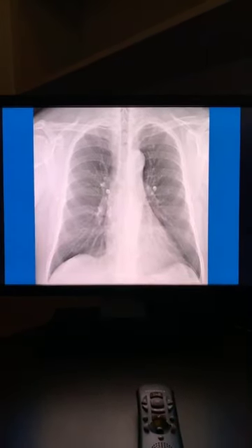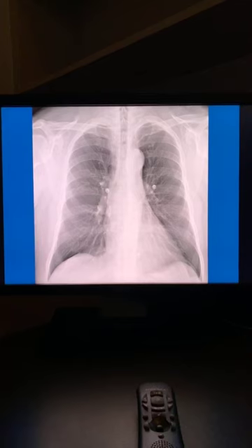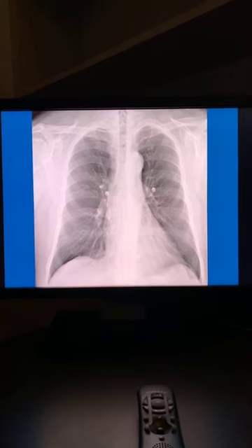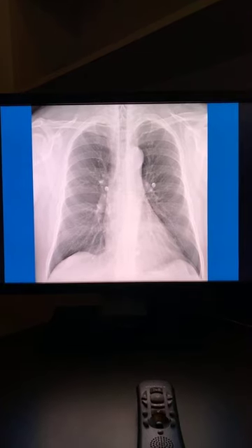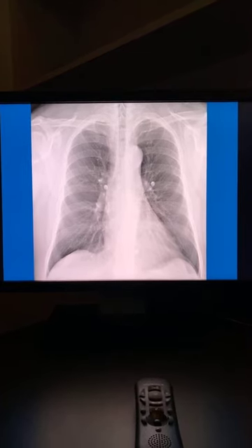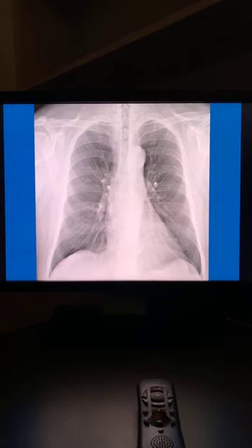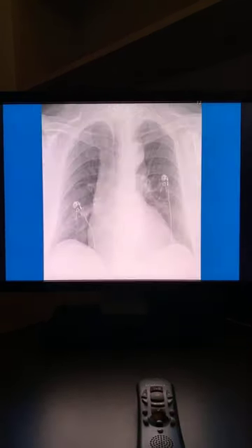What do we got? Anybody want to shout it out? This is interactive. Normal, badness. What else? You want to repeat? Tell me. I'll give you guys 2 seconds, and I'm going to move on. This is a 2-parter, so let me get you the next portion, the next part of this examination.